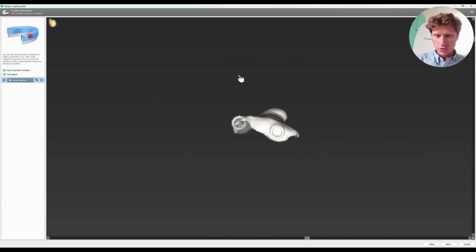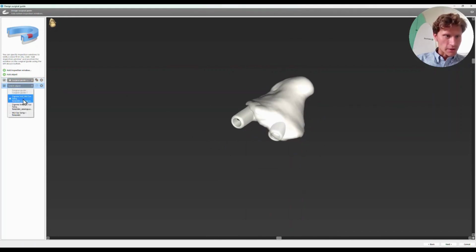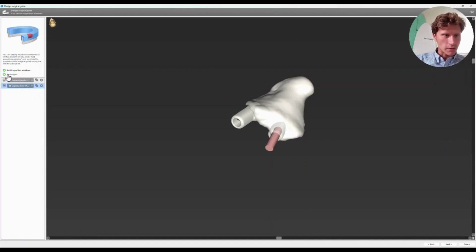You don't need to select anything more here. For the next object, you select the template analog, one and one more. You see that the selected objects are gray and you cannot select them anymore.